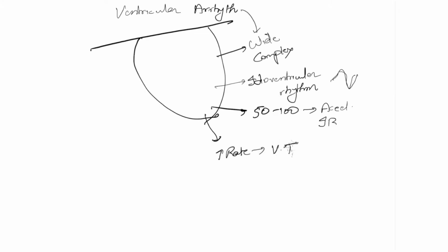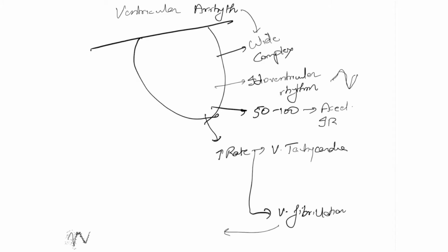The first one is ventricular tachycardia, and the second one is ventricular fibrillation. Now, when we're talking about ventricular fibrillation, the QRS complexes make little sense, and all you might see is a very uneven baseline looking like that. There really is no rhyme or reason to what you see in the ventricles.